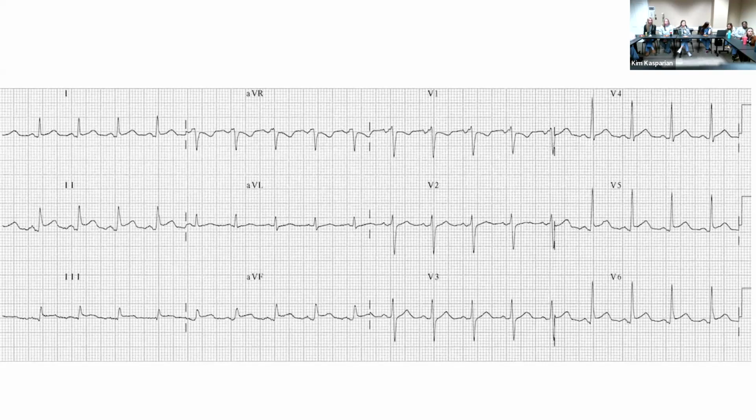You can see it pretty well in lead 2 and lead 1 and like V6. It's always subtle, and then the same here, but you might be able to see that the PR interval is a little bit below the TP. So we have diffuse ST elevation and diffuse PR depression in a patient who has chest pain that's relieved by sitting forward.